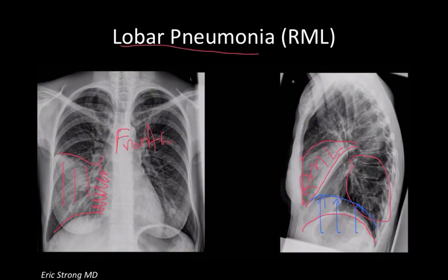There are other things you can look for to decide which diaphragm is which. Usually the diaphragm that extends farther in space is the right hemidiaphragm because it's farther away from the cassette. And the diaphragm that cuts through the heart is the right hemidiaphragm because the left hemidiaphragm is going to sit underneath the heart and it's going to be silhouetted by the heart usually.